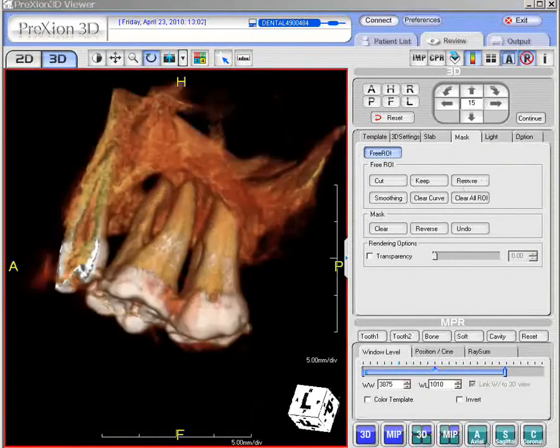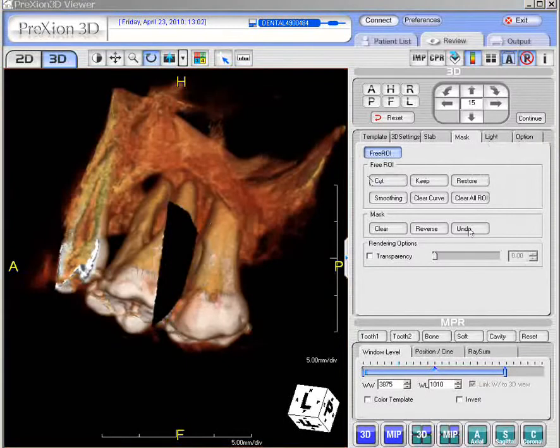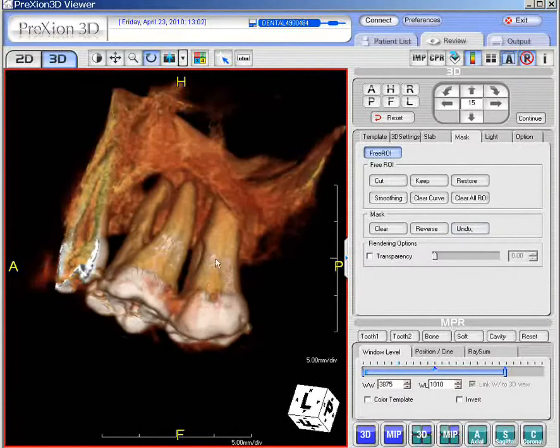Let's say you make a mistake in the way you cut. For instance, let's do another cutaway of a section. Let's say we were going to really cut this section and we make it, oops, we kind of cut it too short. Well, what we can do is go back to the right side, click the undo button on the right, and that will get rid of the last section that we cut away. The last cutaway that we did will restore it back to that position.